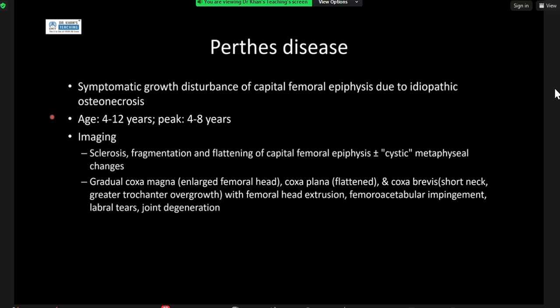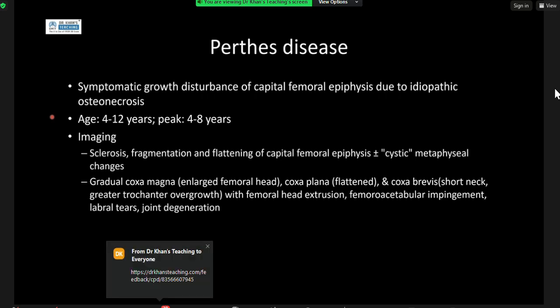Or is it fragmentation of the trabecular bone? Is it some deposition of fibrofatty tissue or granulation tissue because of whatever that altered blood flow within the hip joint? The cool thing is these are actually not very rare, and in literature it's reported that they are seen in a delayed phase of Perthes disease. So it could actually help you to say this is Perthes disease, to be quite confident. But of course, always correlate with the clinical history.